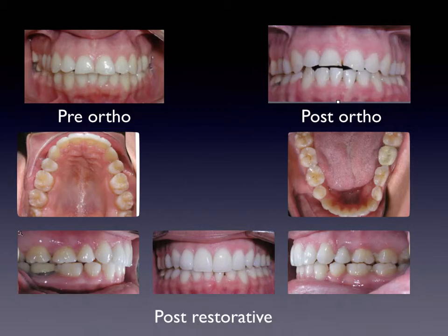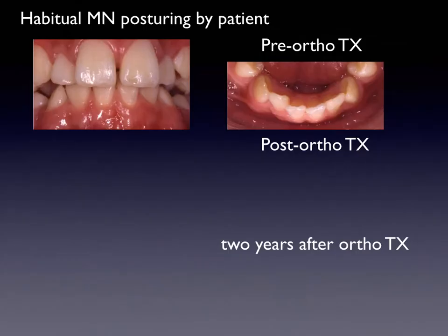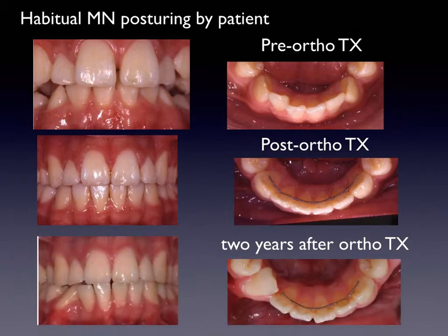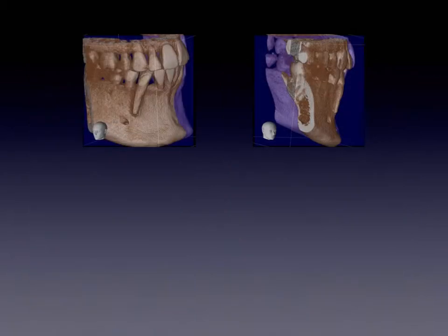The next case is when teeth are very crowded still after a serial extraction, and the correction worked out really good, a bonded retainer placed, and then the patient gets a habit of playing with their lower right canine tooth, pushing against it and pushing the crown in. It rotates around the bonded retainer, root goes labial, and this is pretty amazing. Let's look at the radiograms.